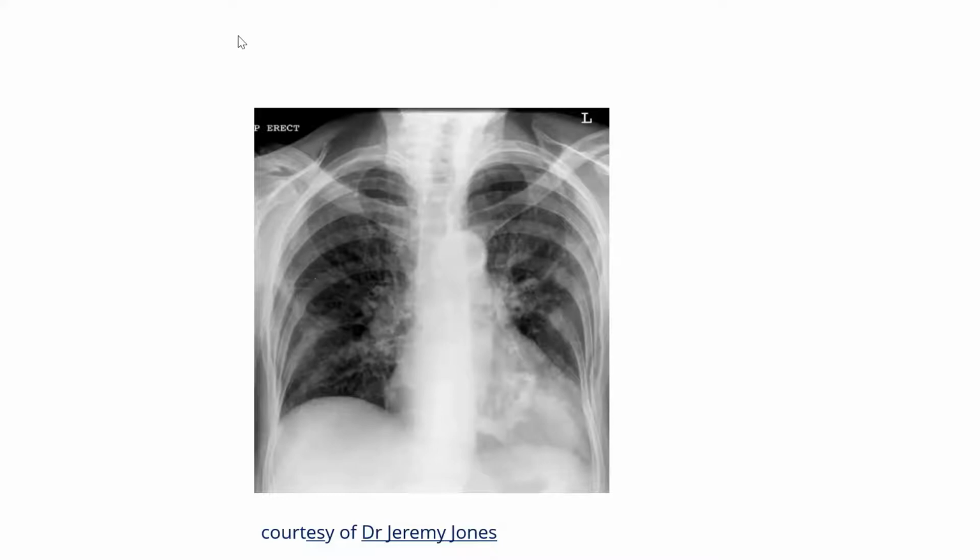Yes, good, good. And I just want to take you to this. What do you think about this calcification here? Maybe coronary sinus calcification. Or another guess? Mitral valve. Very good. Mitral valve. Who said so? Me, Mazin. Yes. Mazin, you are so right.